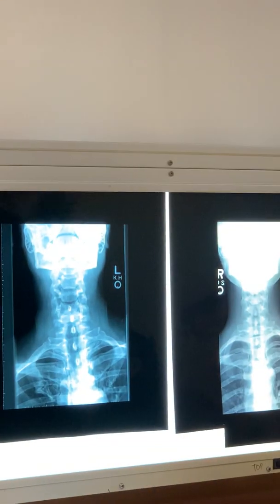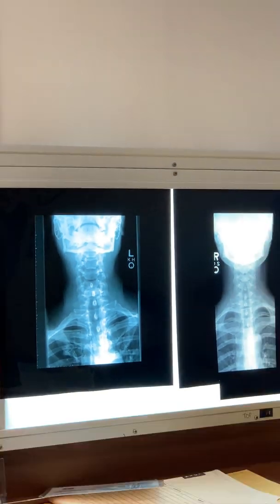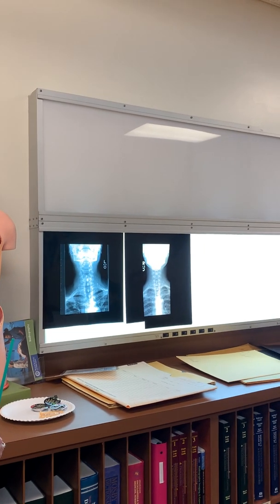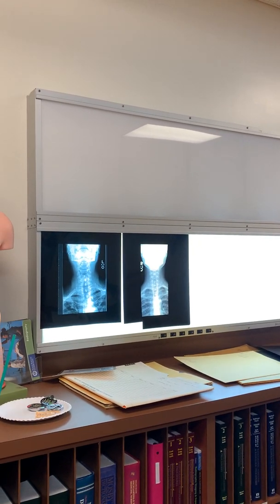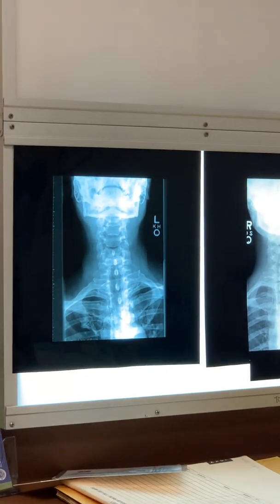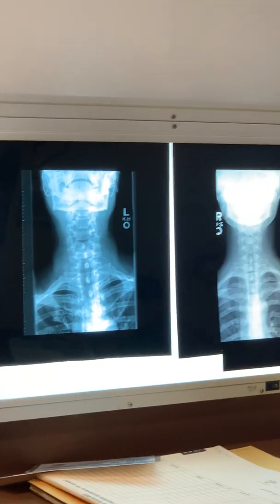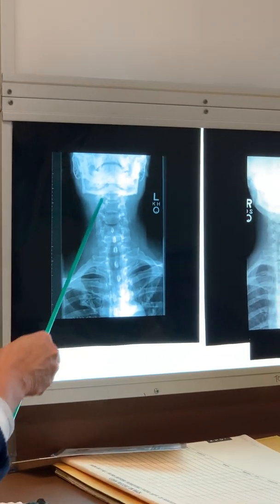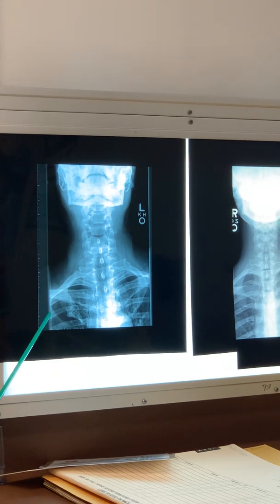You guys have a brain fart with this? Intervertebral? No. Apophyseal joint. Okay, remember C1, C2 apophyseal joints. You can see it in an AP. Okay, so this is the apophyseal joint of C1, C2. The only one you can see it.